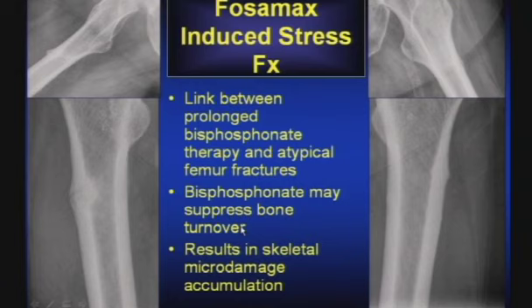So how many of you have seen these in your practices? I see a few hands. Yeah. So I'm surprised that it's so few hands. So let's go over the findings here. And as you go back to your practices and look at your hip films and your femur films, really look closely at them because this diagnosis can be a very, very tough one to make.